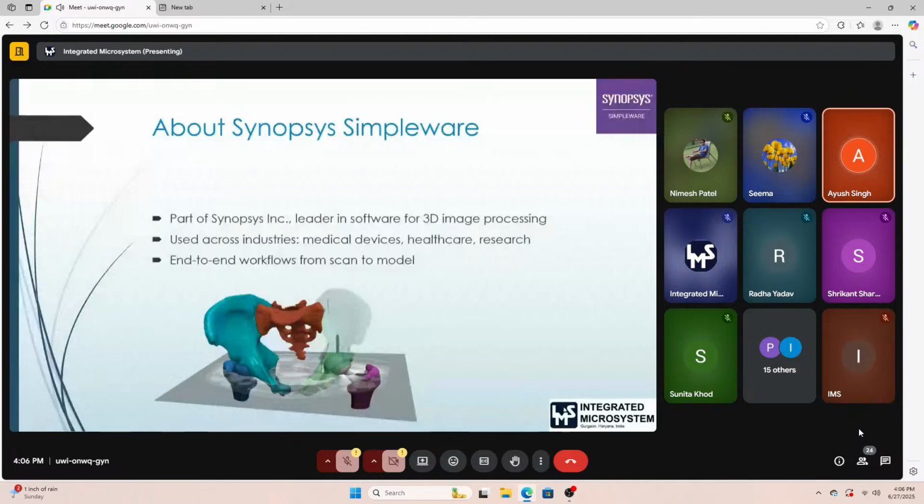That helps us in generating an end-to-end workflow. We can have the integration with the implant dataset. We can do virtual X-ray generation to check whether the positioning is proper or not, or even if there is a minute mistake in our segmentation, that can also be checked using a dice score calculation or by overlapping the particular mask that has been created with the volume rendering of the dataset.